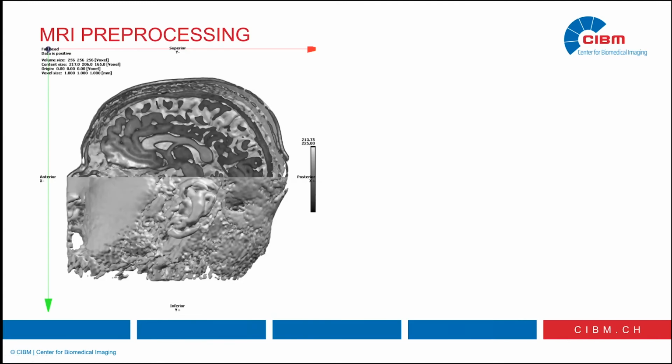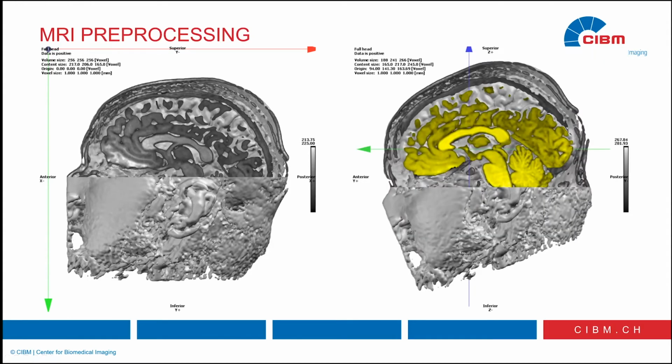Let's have a look at some real life examples. On the left is the real MRI that somebody gave me. A physician gave me that. I did not need to blur the face. You see that the MRI is totally corrupted. Everything on the bottom part looks like the head has been removed from the body. There is a lot of noise and a lot of bias field. After the pre-processing, this is what we have.